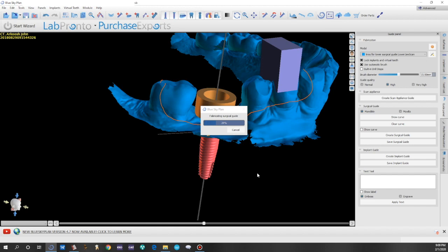The exportation process does have a fee associated with it, so as you are ready to export, just evaluate that it's exactly the way you want and you're not exporting extra things, so that when you go to print your guide, it is exactly what you want. Unfortunately, I have done it incorrectly and had to reprint a guide, which increased the cost significantly over time. So here we go, almost ready to finish our guide.